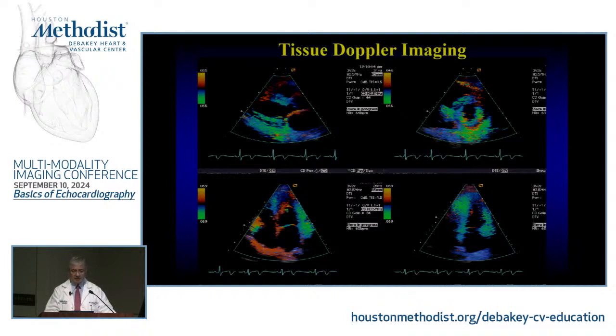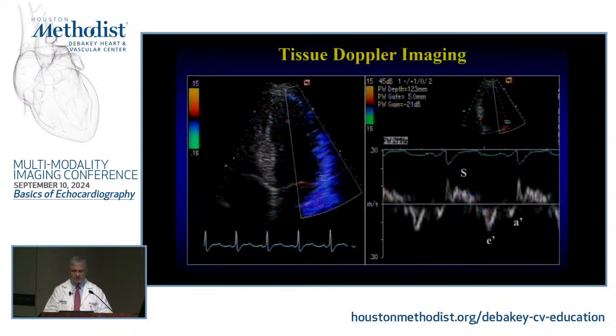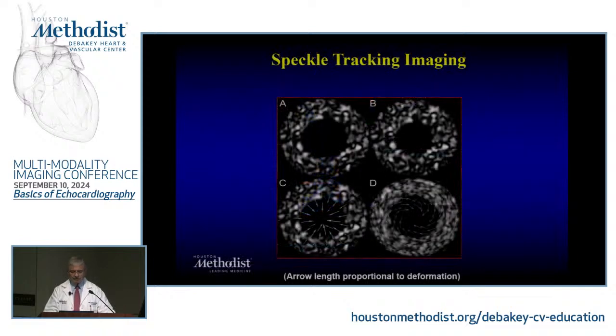So take a look here. Now I have color Doppler of tissue, okay? Color Doppler of tissue. And because it's very different than the blood, you can isolate it differently. You don't have intermingling of these two structures together. Then came pulse Doppler, pulse tissue Doppler, that you could take a look at. You use it for diastology and ventricular function.